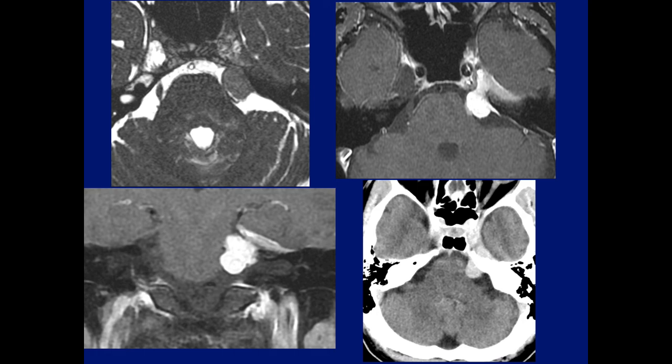Any diagnoses? This patient was not operated on, but I think we can at least surmise what this may be.